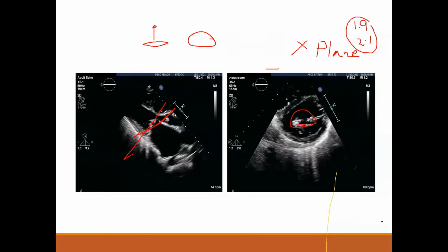This is so important. But sometimes you have so much calcification that you don't see so well which to trace and which not. This is one of the limitations. It's not an easy thing as well, there are sometimes difficulties. But definitely it is much easier than planimetrizing the aortic valve, because the aortic valve is usually heavily calcified and you lose the tracks.